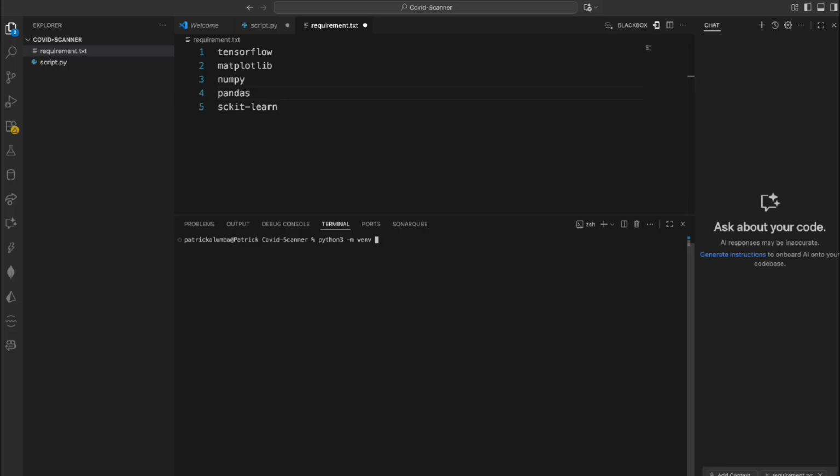You don't need it there. So we just need all of these libraries inside a specific container, which is this particular project. So we're just going to go ahead and name it anything. We can name it COVID, or I'm just going to name it VNV. It doesn't matter, whatever you want it to be. Click OK, and it's just going to create that virtual environment right here.